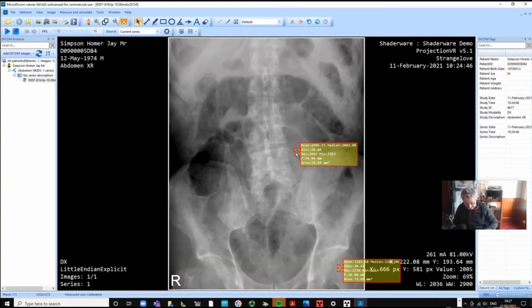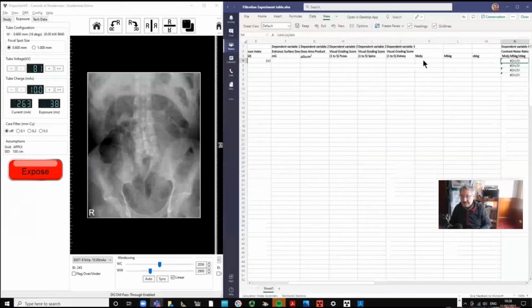Yeah. Right, I'm going to save those because when we put a new image in, I'm going to be able to paste them in exactly the same location. But in your methodology, you're going to have to describe the location of the regions of interest. Okay, so can someone read them back to me?